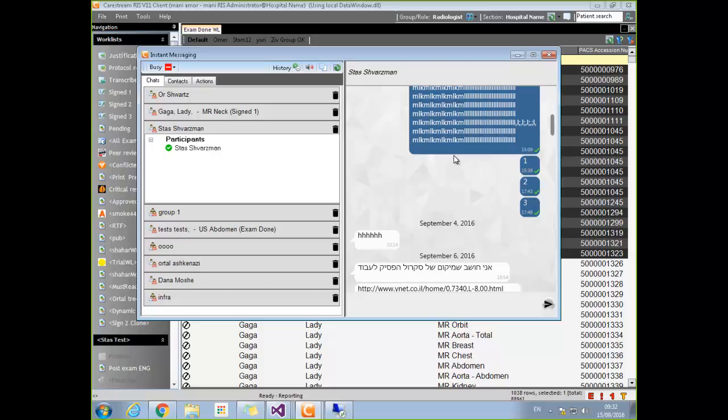In the environment that we have here on your machines, the chat probably will not work because of two things. One thing, I don't know if the instant messaging service is running. The second reason is that the drop that I have here is, I think, from 2-3 weeks ago, and we had some issues at the time.